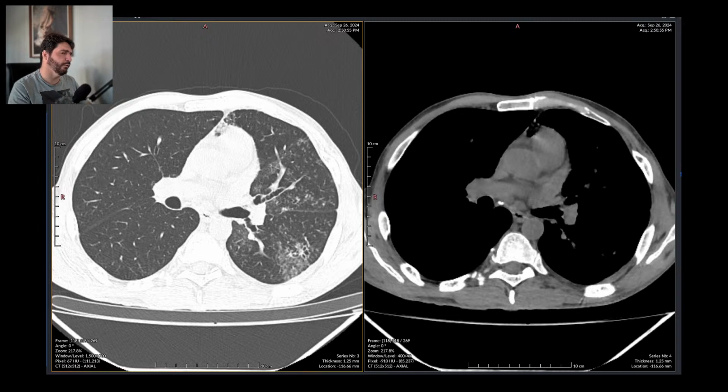But we usually do imaging scans and the skin testing, and we physicians are used to doing a treatment test. They put the patient under treatment for tuberculosis when they are quite sure the disease is there, especially on image scans like this one, and with positive epidemiology such as mild fever and weight loss. That's what it takes to make the diagnosis. It makes no sense.